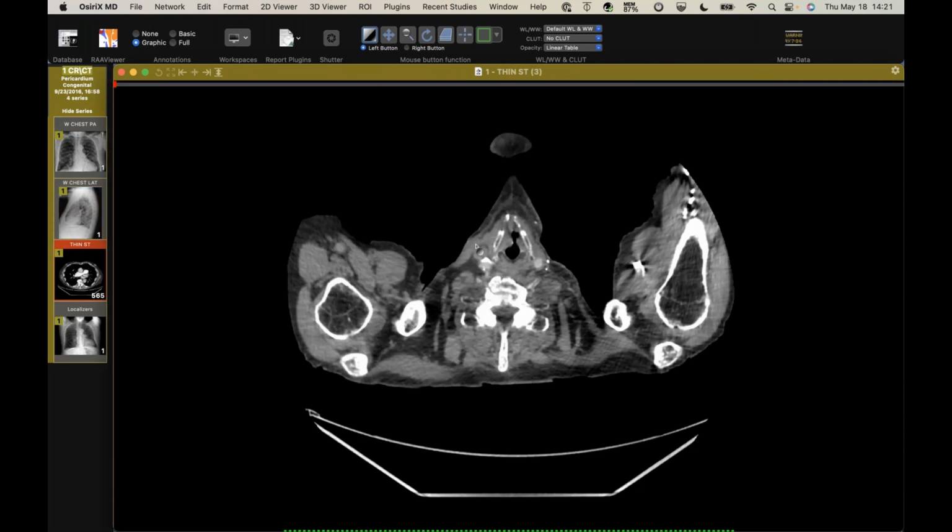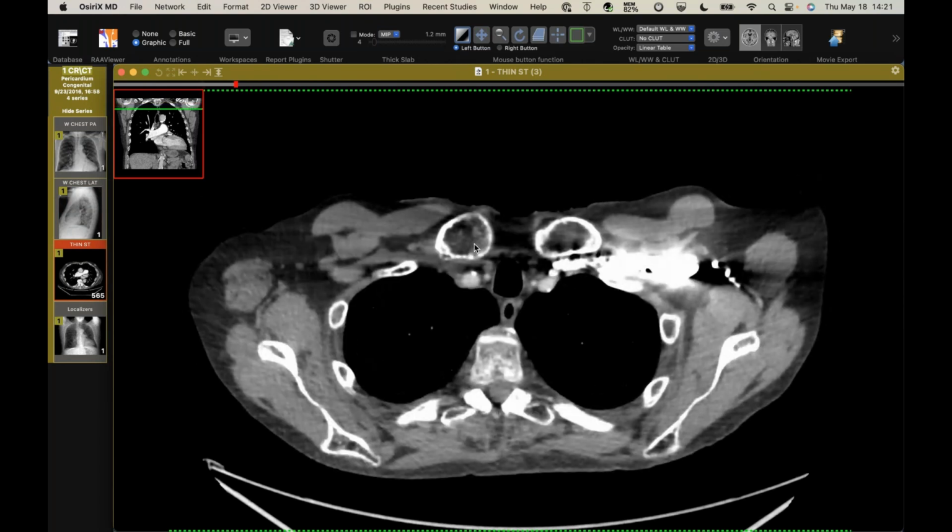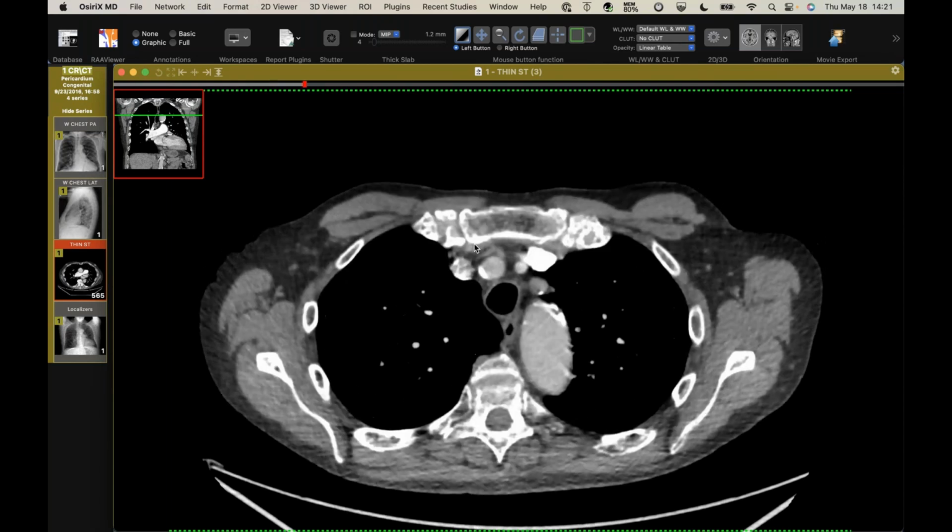So I found an older contrasted CT on this patient. I think this patient had had multiple imaging for metastasis surveillance. I don't remember. This was an incidental finding.